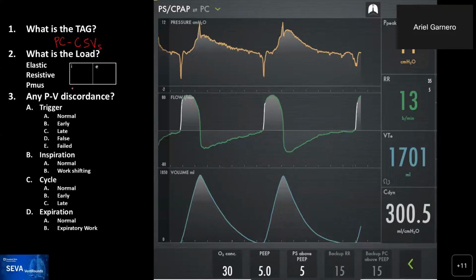I mean, when I received the patient on pressure control, I knew right away that we couldn't use any mandatory breath at all, and we couldn't impose any breathing as it was seen before with the mandatory breath in between. So the only option here was to try to make the patient as comfortable as we can, and pray that the large tidal volumes didn't have any consequence. That's the only thing. It was sad to see, but we couldn't do much more than this at this present time.